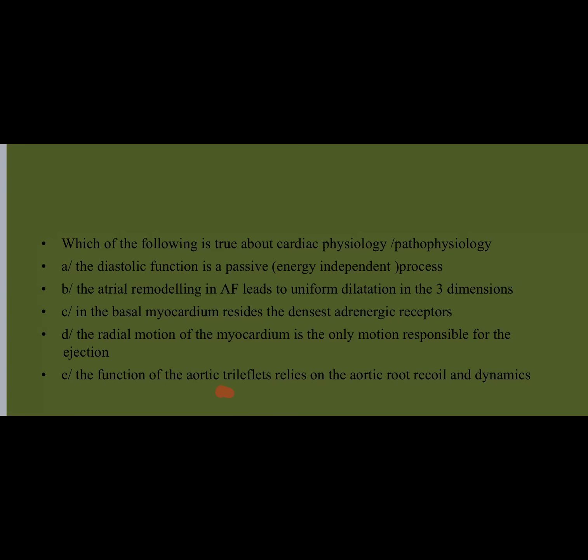Now, can you read B? Atrial remodeling in AF leads to uniform dilatation.